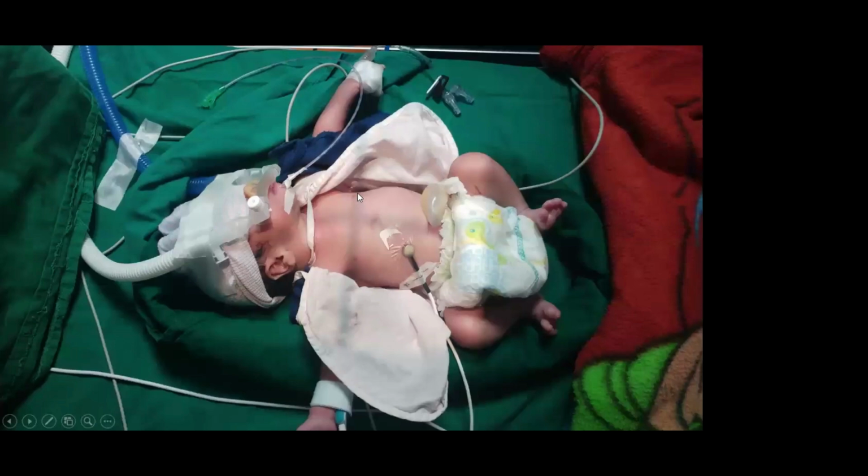So the horizontal line should come at the level of the nipple. This vertical line will come. And can you see where these lines end? More or less not. Okay, that means the scatter is too huge. So then there are shutters available.